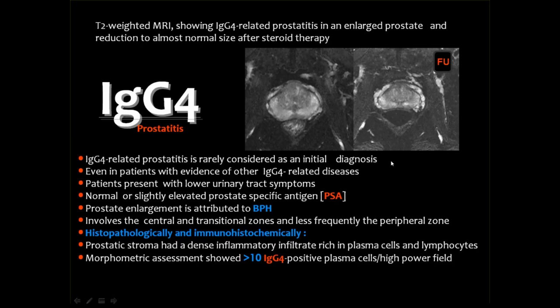And IgG4 prostatitis is rarely considered as an initial diagnosis. You know that there are a lot of lesions that can involve the prostate. So it is very difficult to diagnose IgG4 related prostatitis as a single entity.